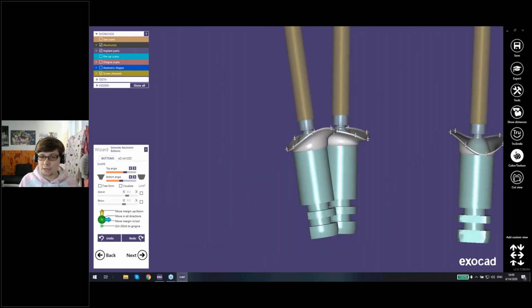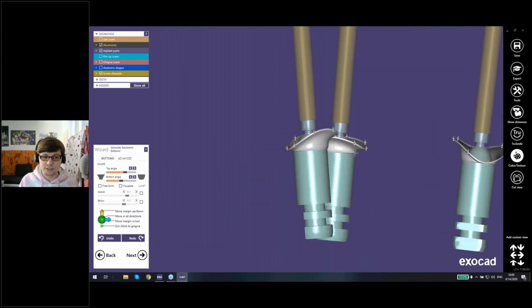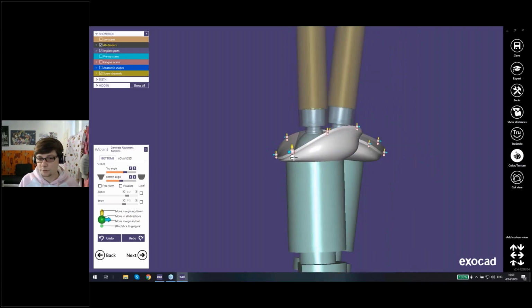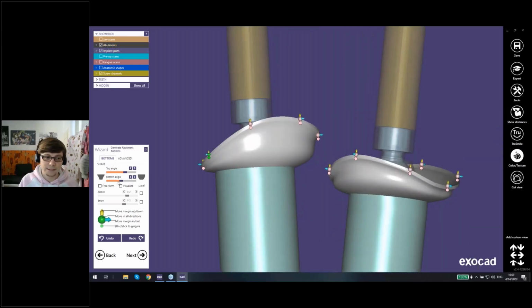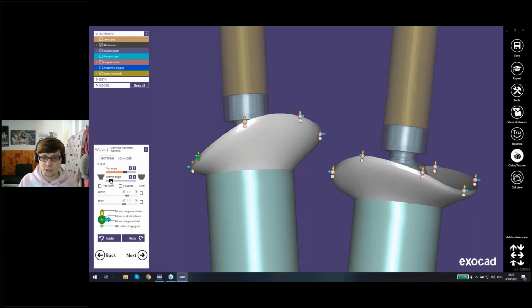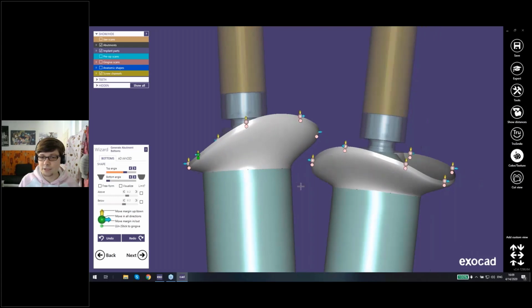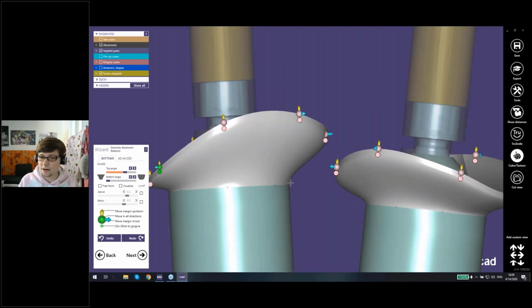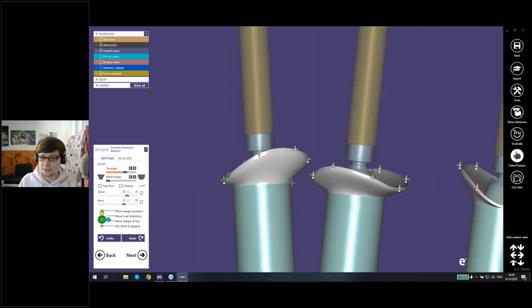So in here, you can design the shape of the abutment bottom. And for this, you have several different tools. What I prefer to do is, at first, I like to use those two buttons here to get a more convex or concave shape. You can click on them, and the more you click, the more convex or concave the shape gets. And then afterwards, you can change the angles. You see here, there's the top angle and the bottom angle. And if I change this one slider, the bottom angle changes to a more concave shape. And this whole area tends to stay really smooth. The software tries not to give you any hard edges, so you get a really smooth shape in here.